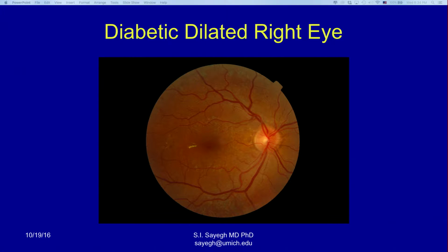Okay, so I had a radiology professor, and she used to tell us, hallucinate with me. So hallucinate with me and look down here and tell me if you see anything. So this is like this brown, yellow little dots. These are actually laser spots. This eye has been lasered, and it has been lasered because it has diabetes, right? So these are lots of little things that I'd like to pick up, so this tells me that yes, it has diabetes.